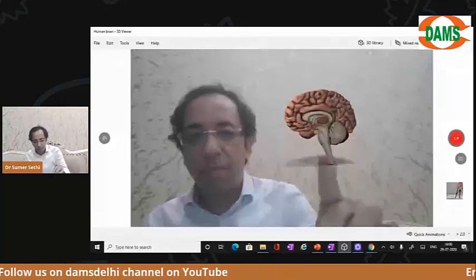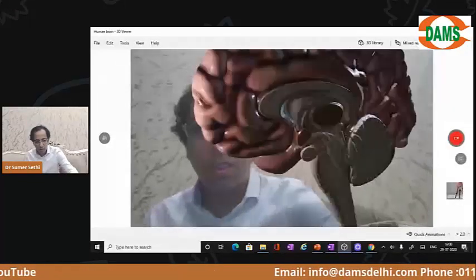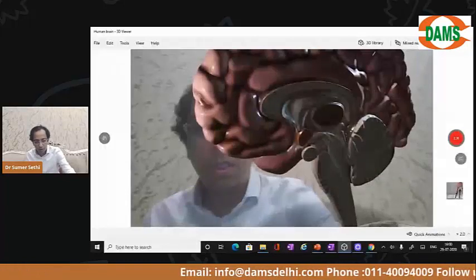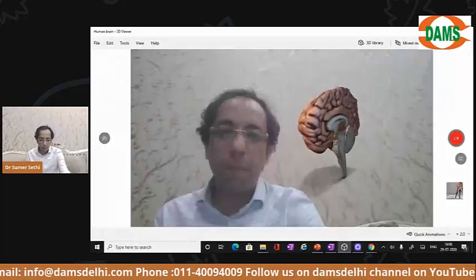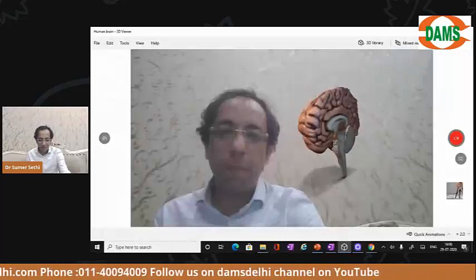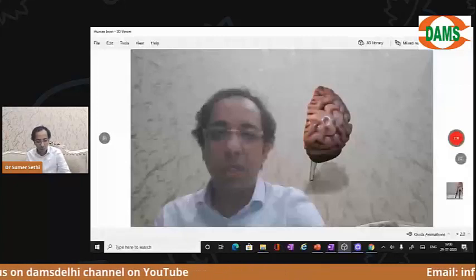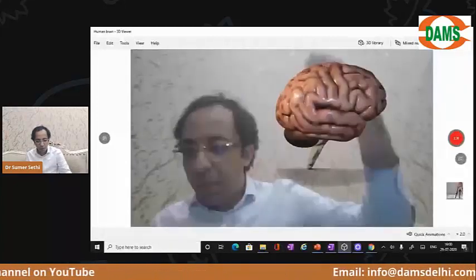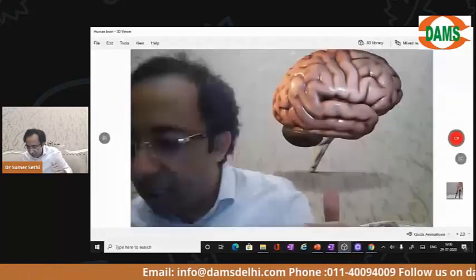Okay. So I'm sure you can pick it up. Slight bit of technology. I'm just playing with it, just to show you what I'm trying to say. Okay. So that was the medial surface. While on the lateral surface, there will be slight lag here. Don't worry because of the scenario. But just see the brain here.